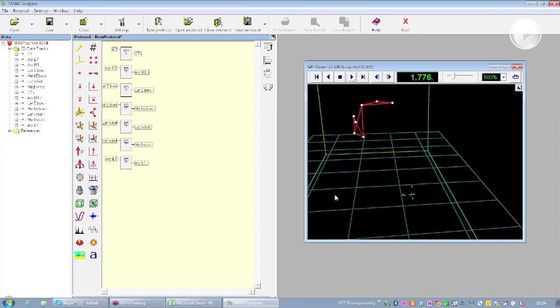It is important to be aware of the fact that a 1D angle is an angle that changes its dimension on one plane. So what I'm going to do is to create a medial point between these two markers and the medial point between the two condyles of the wrist, in order to have a 1D angle of the flexion extension of the elbow during the movement.